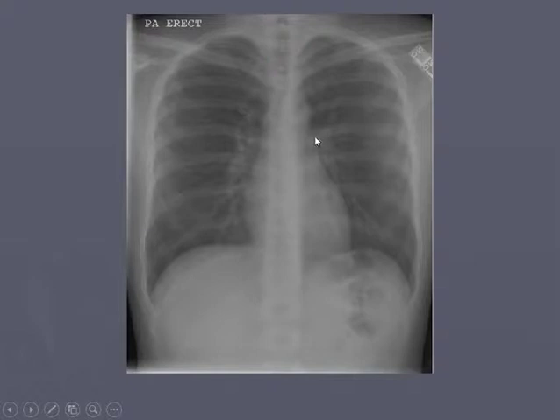You know, the left pulmonary artery branches off right here, going up and down. The right pulmonary artery branches off here and here, going down. See that this level is not the same level as this. This is normal. This is what it should be. We should see about a 20 or 30 degree difference going from right to left. It should be uphill sloping, not real crazy like up here and down there.